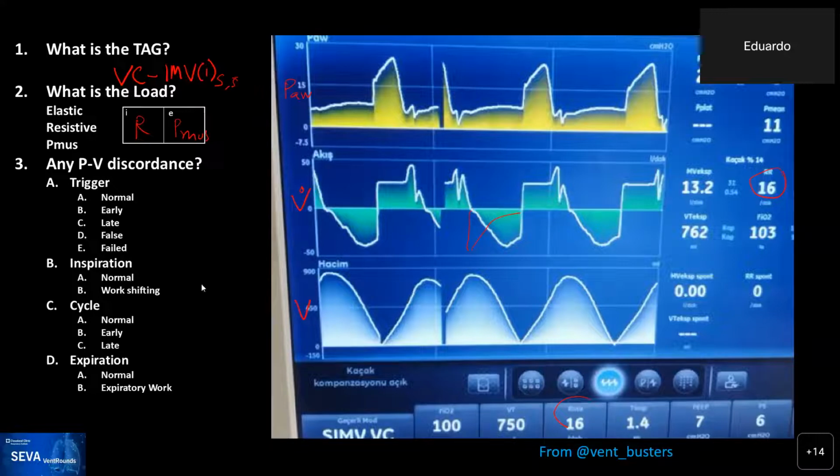Let me see, there's a comment here. I'm going to make it a little bit bigger. And so, excellent. So that's right, Tara. You recognize the absence of exponential decay.